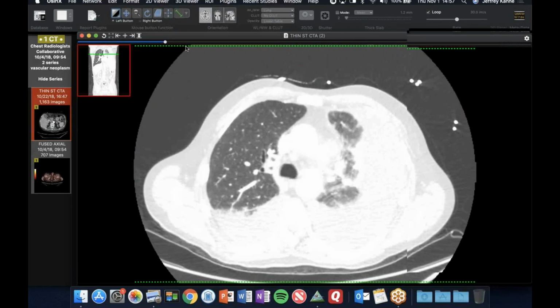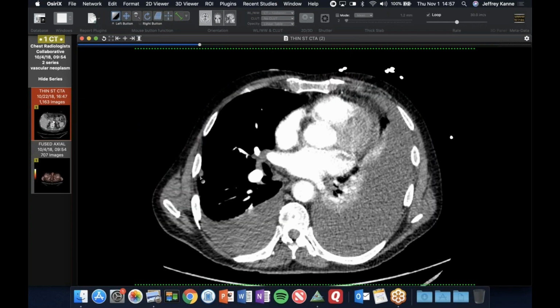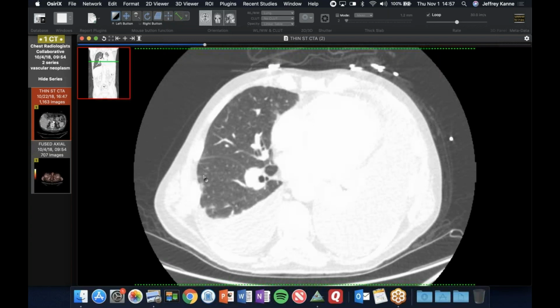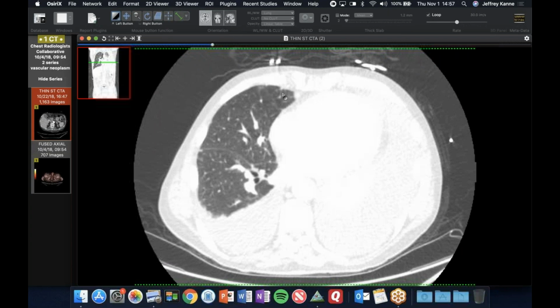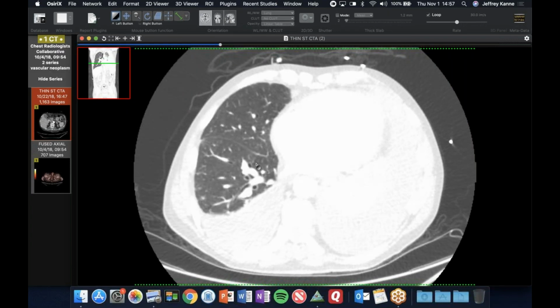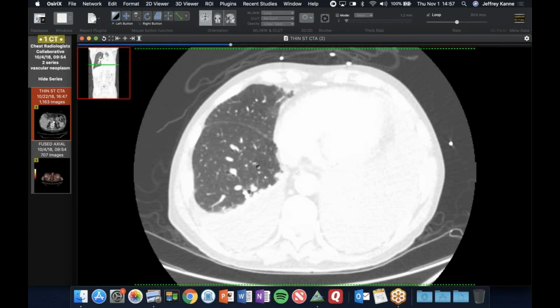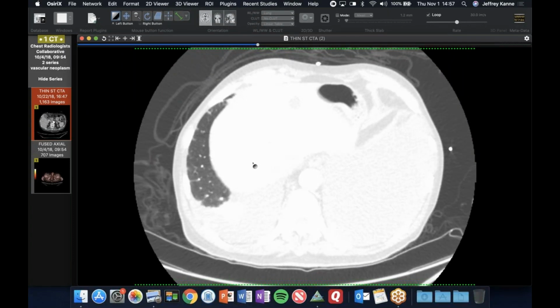And then there's a couple of other interesting findings. Look on the right. There are these subpleural nodules in the right lung, and a few of the bigger ones have a little hypervascular component, but they all have these very shaggy borders, even in the non-dependent lung. So clearly, I don't think this is just atelectatic lung. I would wonder if there's pleural involvement of this side. Look at these nodules along the fissures as well. So I think these are bilateral pleural metastases, malignant effusions. And so they did a pleural biopsy, and interestingly, they got angiosarcoma.